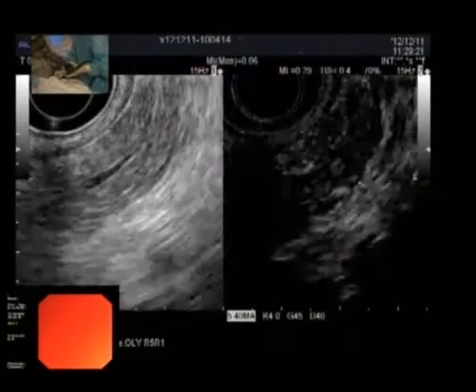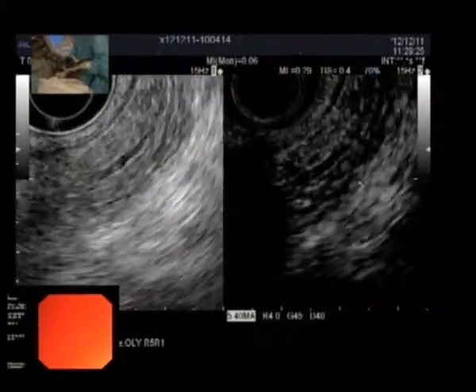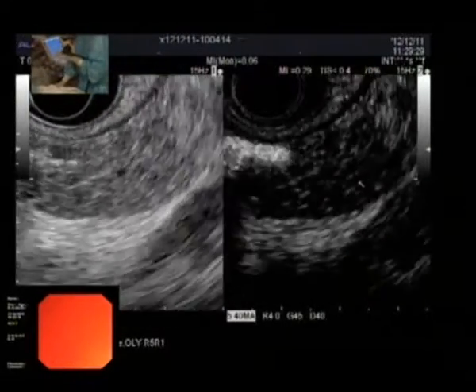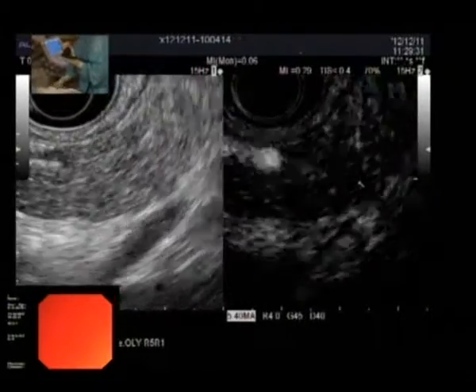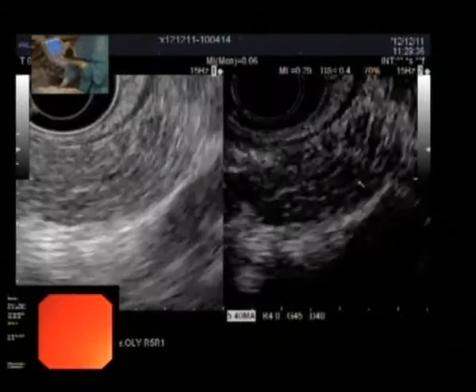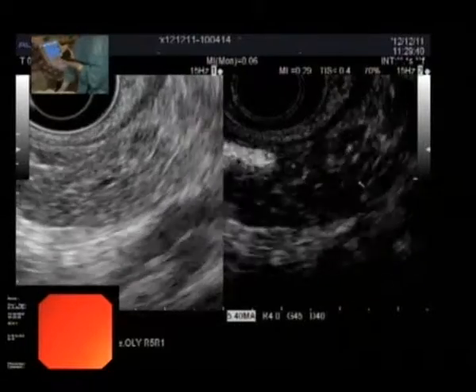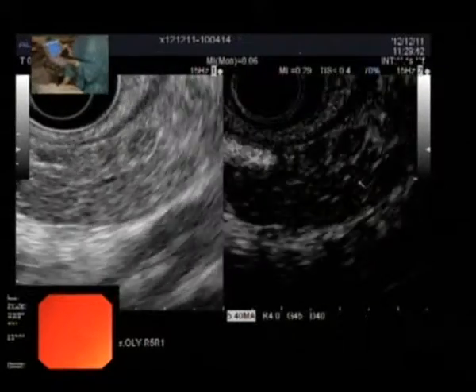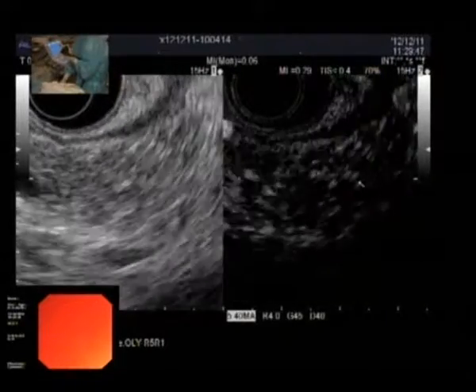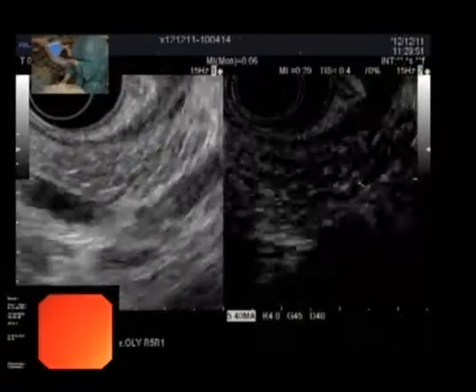For autoimmune pancreatitis, apart from a sausage-shaped pancreatic tail like this, do you expect to see any special feature from EUS? It's a bit similar to chronic pancreatitis, but autoimmune pancreatitis also shows a bit of enhancement. But there is some kind of lobulation, not homogeneous enhancement. So there is a little bit of difference between normal pancreas and autoimmune pancreatitis.